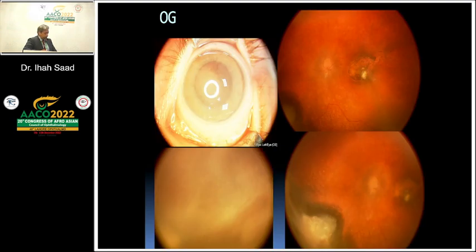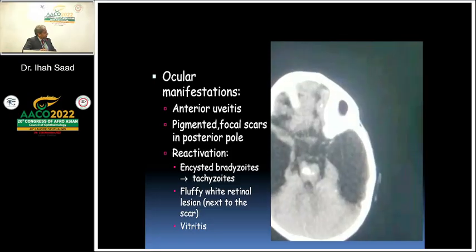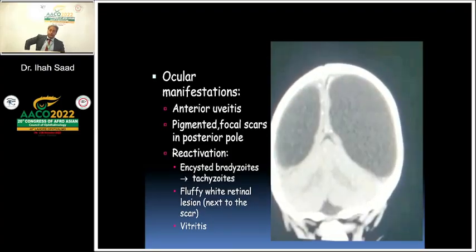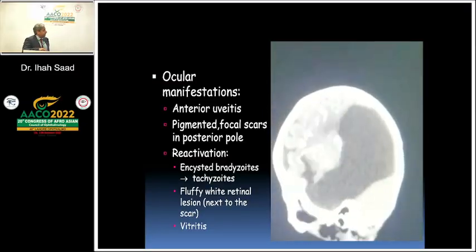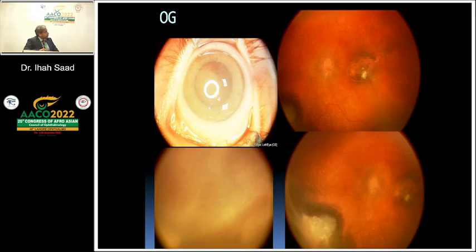And actually, what happened is, going back and asking for a CT of the brain, you can see the CNS severely affected from hydrocephalic changes, and you can appreciate also the intracranial calcification that was associated with toxoplasmosis. This is a congenital form of toxoplasmosis.